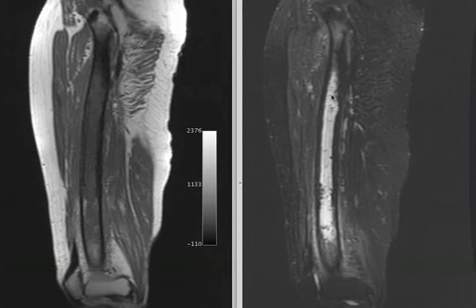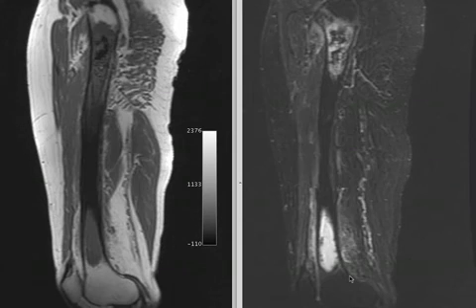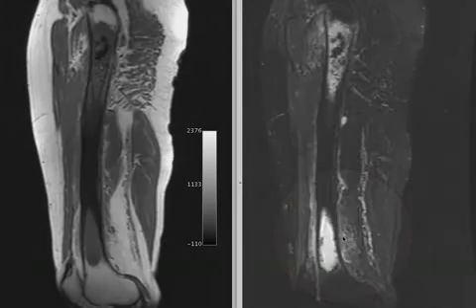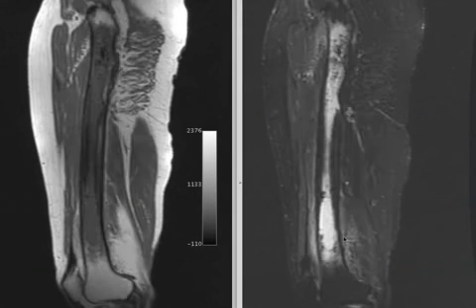some smaller calcifications here, but as we go further down the femoral shaft, the signal is somewhat more homogeneous, but we can see how extensive the signal is going all the way down to the distal femoral diaphysis. In addition, there's some periosteal reaction along the distal aspect of the femur that indicates some reaction in this area.